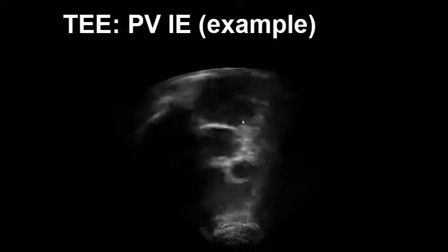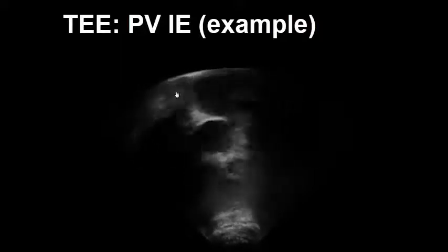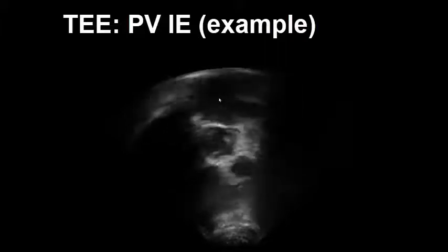And last but not least, we have an example of pulmonic valve endocarditis as well, which is extremely rare. Although these images were captured on transthoracic echo, we have orientated the views as if the patient had a TEE performed. So what we can see here would be the equivalent of the aortic valve short axis with the aortic valve and its Mercedes sign in the middle, with a wraparound of the RV inflow as well as outflow view seen here. RA, tricuspid valve, RVOT, and finally the pulmonic valve seen here. The interatrial septum is in between the right atrium and the left atrium seen here.